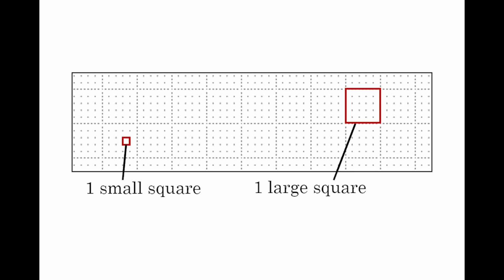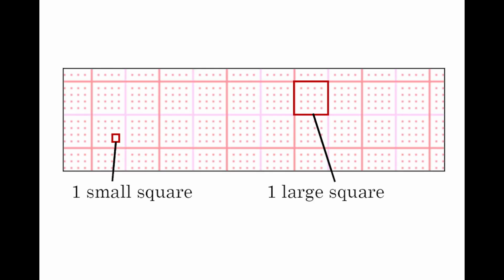Sometimes the ECG trace is displayed on paper with dots instead of lines. Also, lines may frame only large squares and dots may represent small squares. Sometimes two adjacent large squares are marked by thicker or more prominent lines. This is often seen in ambulatory ECG monitoring.